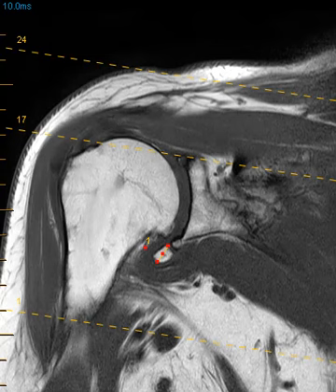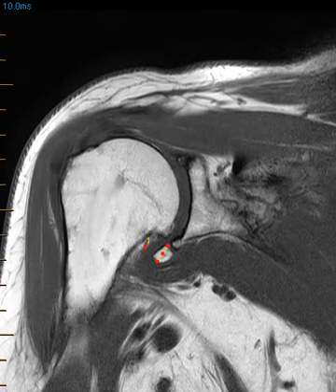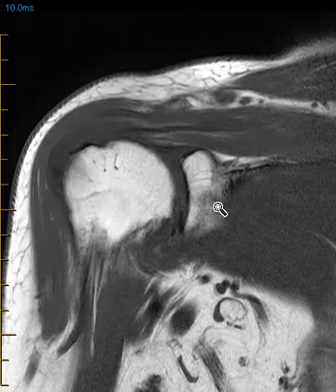Hello, this is Dr. Gay from First Look MRI, and this is a 71-year-old female with chronic shoulder pain here. And we can see on this view she does have a finding here in the very bottom of her shoulder joint, a little loose body. But that's not why I'm showing the case. It is because of this.